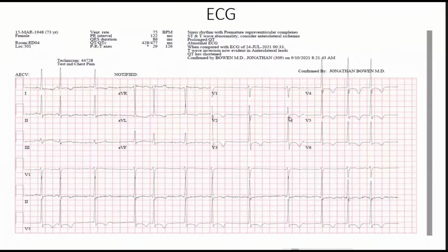Expect to see more of a negative deflection in this anterior precordium if it was true, just global true LVH. You should see a negative deflection here in V2 with this prominent R wave laterally. But yeah, so we have nonspecific changes in the presence of an elevated troponin.